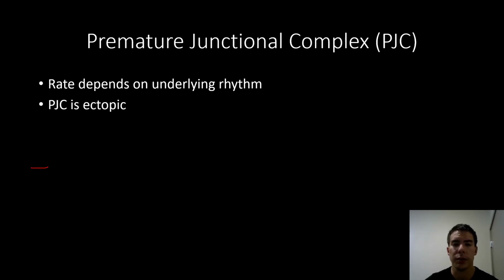So if we have a normal sinus rhythm like this, and then after this beat we have our PJC, we'll just kind of see something like that, and then it goes back.